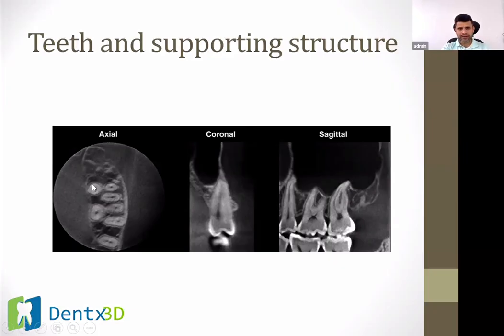So this is the dentine of the root. And the dots which are inside are the pulp canals. Right? So this is the pulp canal, this is the dentine, radicular dentine. And you will see a line surrounding it, that is your PDL space, and then a white line surrounding it is your lamina dura. So it is the basic thing we learn in our third year OMR radiology posting, right? What is radiopaque and what is radiolucent? Right. Similarly, if we see this third image, this extremely white part is the enamel, right? Because it is the most radiopaque.